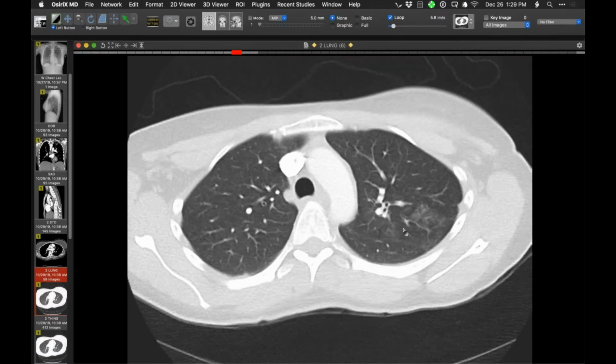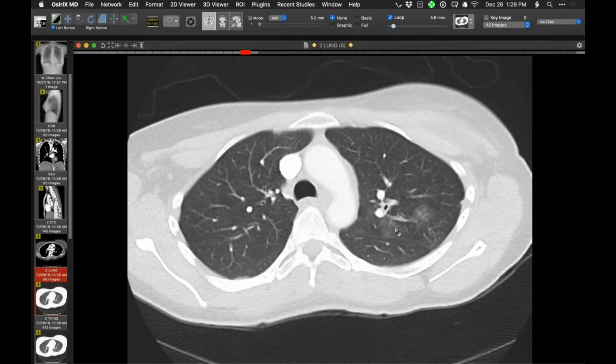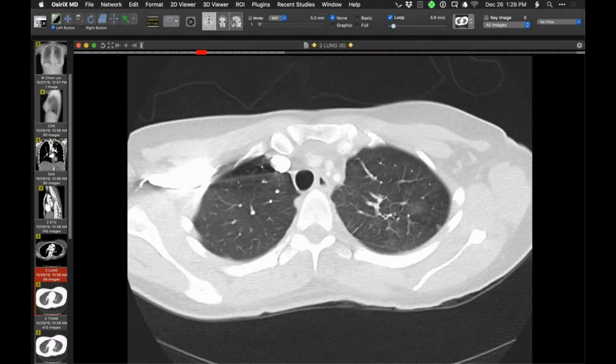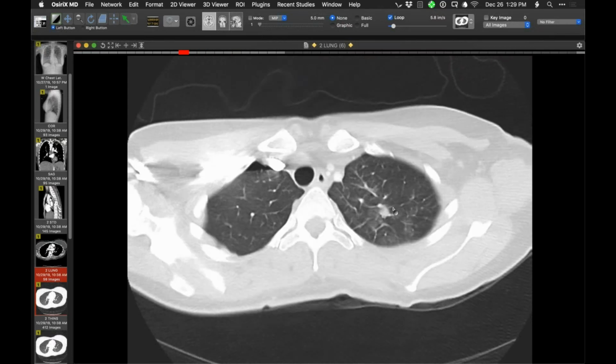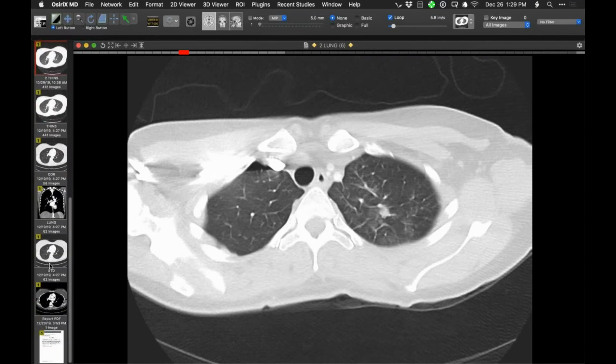So I'm not quite sure what's happening here, why there is some interstitial edema. Is it because there's just the intensity of inflammation? Is there something to do with lymphatics? I don't know why, but there's clearly that process and some interstitial edema as well. So here you have a nasty finding consistent with necrotizing pneumonia. And then I will show you that on follow-up after treatment, and I'll show you the path in a moment.